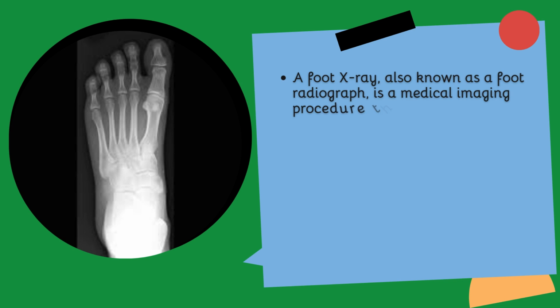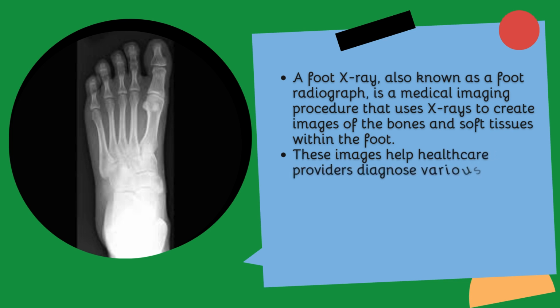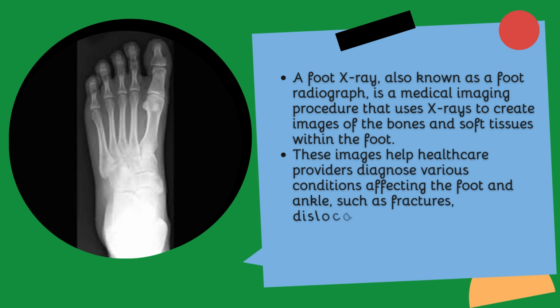First, we need to know what is foot X-ray. A foot X-ray, also known as a foot radiograph, is a medical imaging procedure that uses X-rays to create images of the bones and soft tissues within the foot. These images help healthcare providers diagnose various conditions affecting the foot and ankle, such as fractures, dislocations, arthritis, and other abnormalities. Routine projections for foot X-ray are AP and lateral.